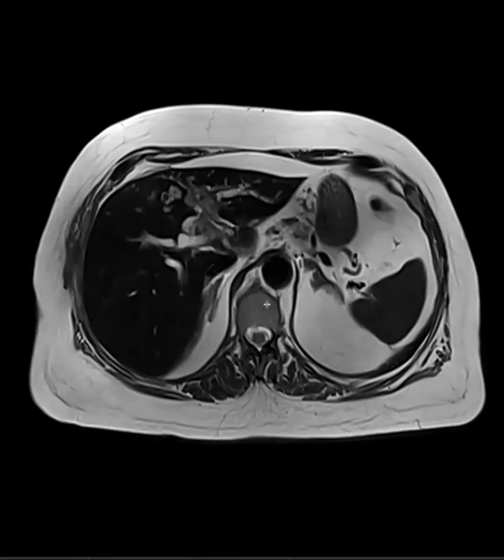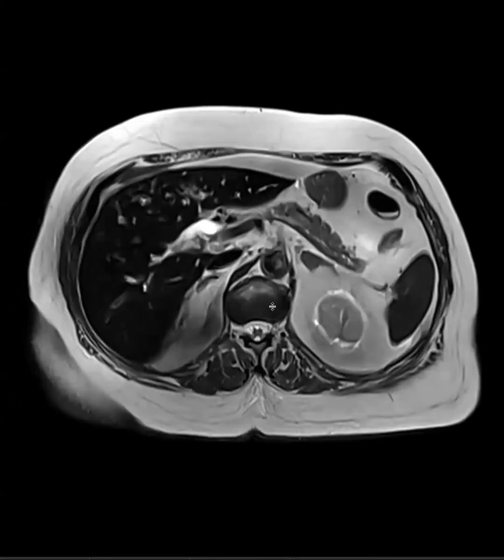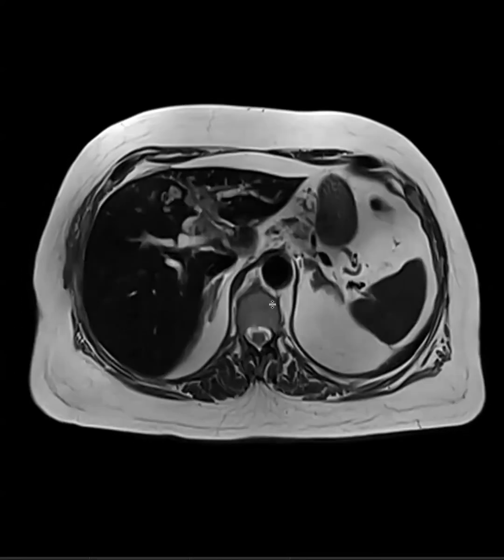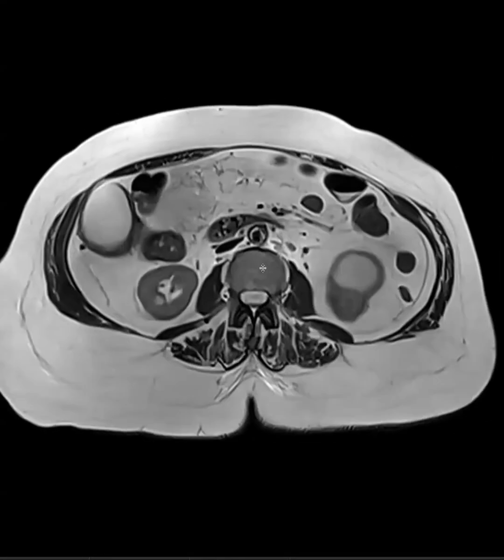Oh, I see. So you think there's no metastasis? No, I think it's a manifestation of a common multifocal disease, like urothelial carcinoma, right? Like urothelial, you have the upper tracts, but the bladder also. You get overlap. That's what I think. I think that makes sense. The gallbladder isn't a met, it's part of the primary. Yeah, that's cool.